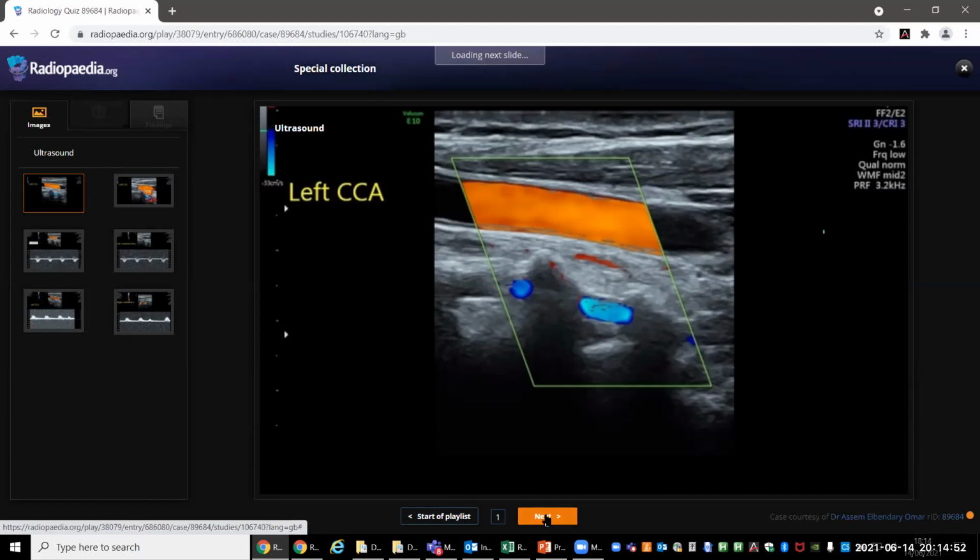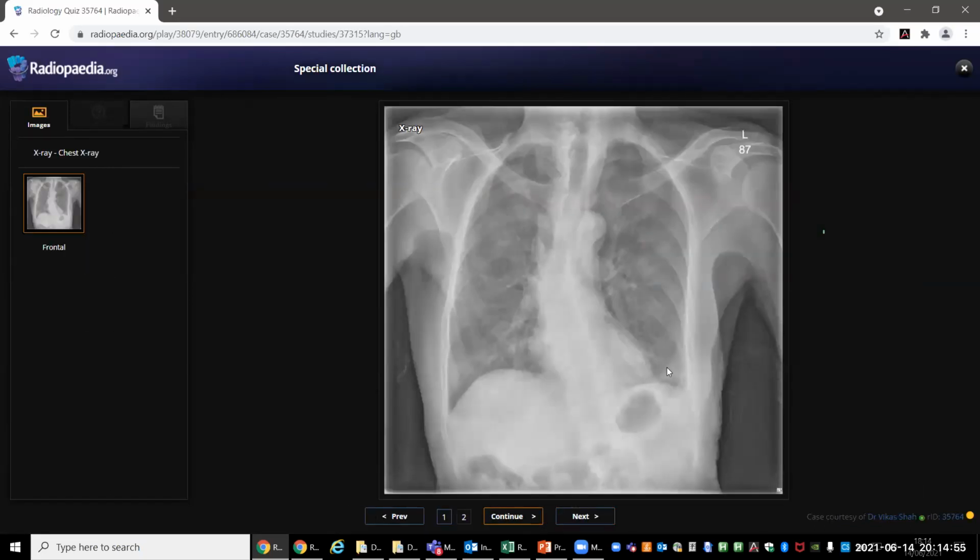The second case, I know it's not the best of images, I'm sorry, but you actually picked the findings. You could see the patchy opacities that were in the lower zones as well as in the perihilar region. So my little trick for a chest like this is once you see perihilar opacities of this sort, I have 4 differentials and it has worked very well. There are 4 Ps: we have alveolar proteinosis, pulmonary edema, PCP, and pulmonary hemorrhage.